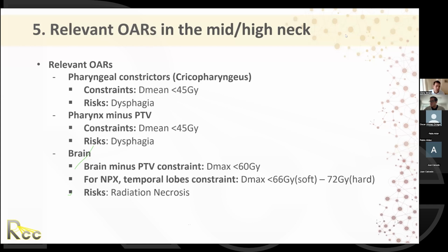And then for the nasopharynx, when we are covering those retropharyngeal lymph nodes, especially, they can be involved. We have to take these lymph nodes to 70 gray. They sit right next to the temporal lobe of the brain. So I've caught at least once our dosimetrists, just when they're planning head and neck, they're not used to pushing on the brain, and so they often aren't even putting that into the optimizer. So if you are treating a nasopharynx to 70 gray and close to the brainstem and or temporal lobe, it's critical that you push on that.